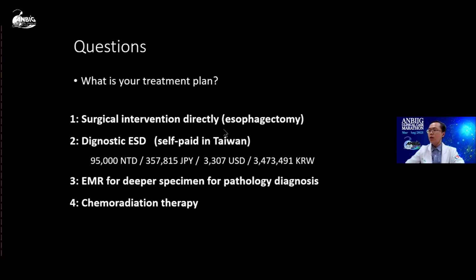Yeah, so most attendees choose ESD. However, in our endoscopic diagnosis, we think this may be deep invasive esophageal cancer. And diagnostic ESD is very expensive in Taiwan.